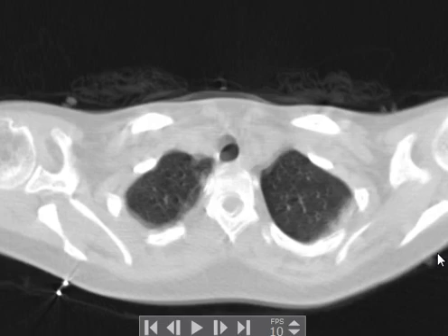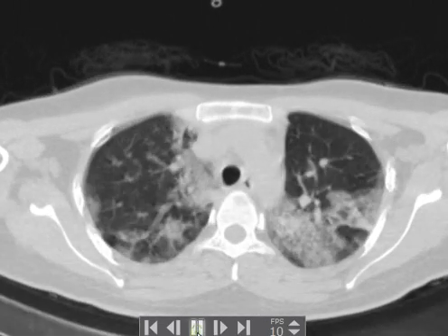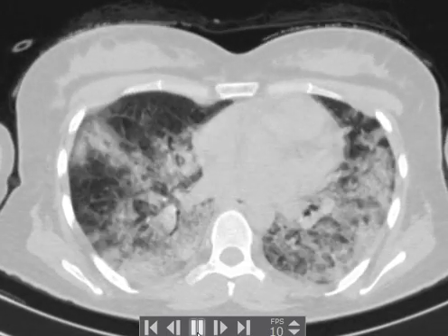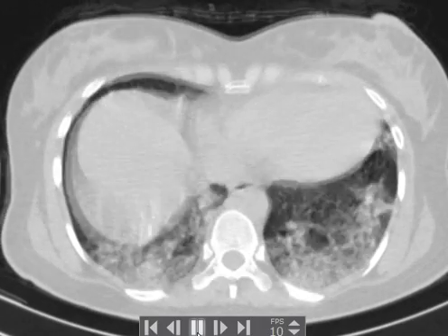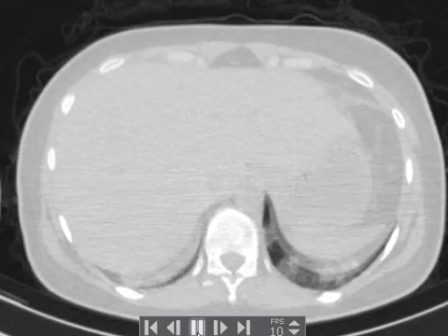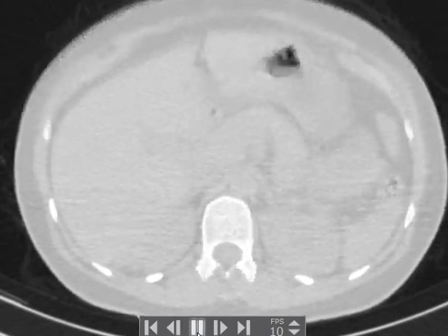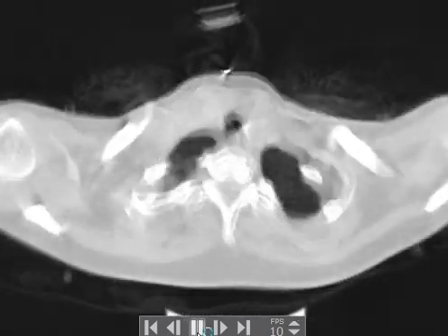First of all, I want you all to take a quick look at the chest CT findings shown here. This is the lung window. It was a CT without contrast. You can obviously notice the motion artifact due to the rapid breathing. The patient was dyspneic and was unable to hold her breath and even a little bit subconscious, drowsy. So the first thing you notice is the breathing of the patient is heavy, fast, and she's dyspneic.